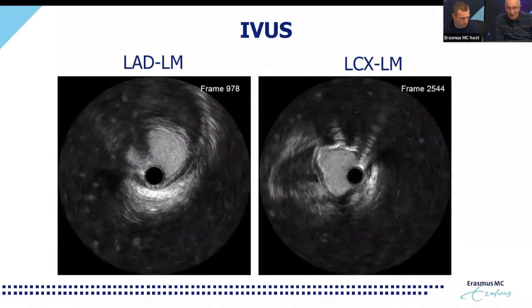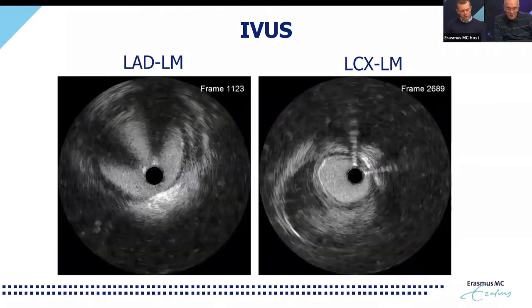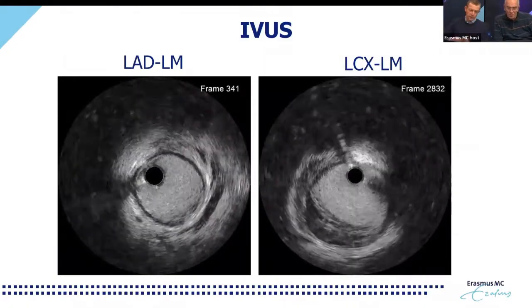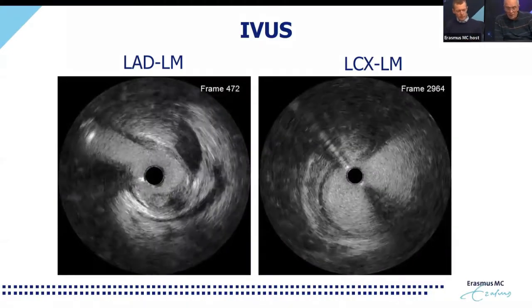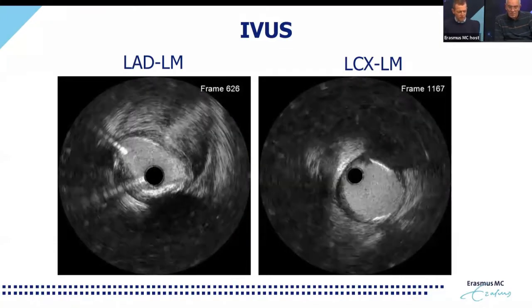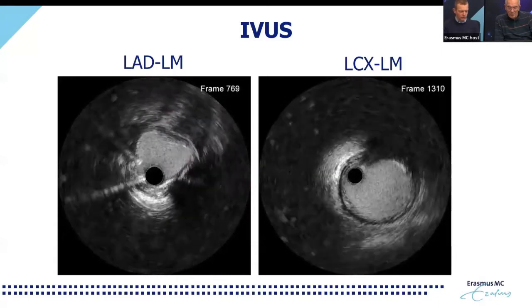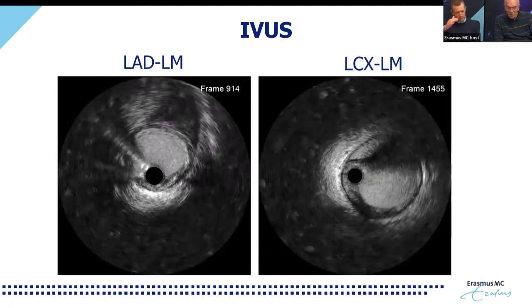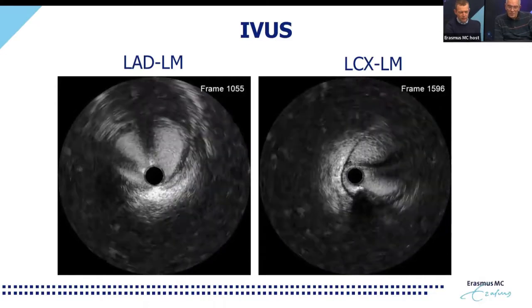Yeah, and what is interesting, Jurgen, what I think is interesting about this case is that typically with small dissections, you see intimal tears and you see the blood going between the intima and the media. But what is in this case very apparent, and that's why we thought it would be a nice illustration for how you can see hematomas, is that in this case, the vascular integrity in this relatively healthy vessel is actually completely intact, except for the fact that just between the media and the adventitia, you can see that here nicely in the circumflex pullback, this vessel is nicely intact.